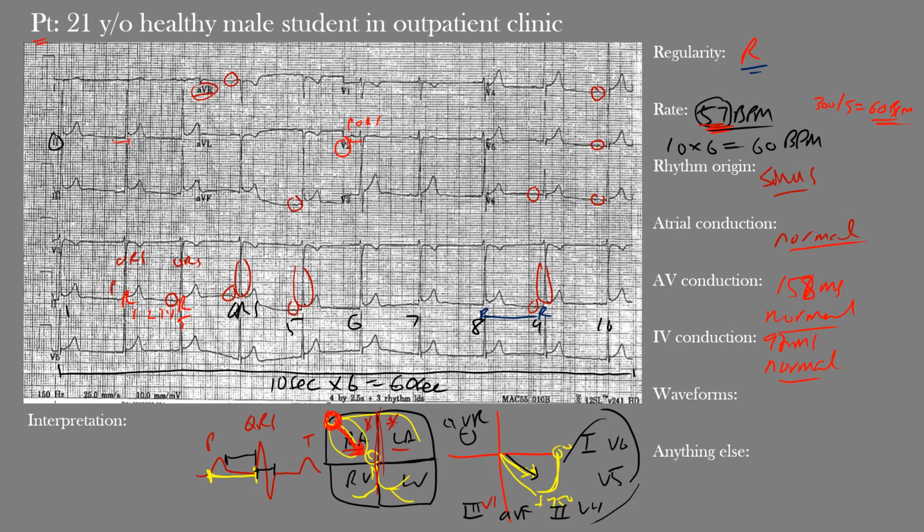The ST segment does appear slightly elevated in the inferior leads 2, 3, and AVF, as well as in lead V3. And there are no reciprocal changes in the lateral leads that would suggest some ischemia is present. So let's look at that. I think that's something to note, and really one of the take-home messages from here.